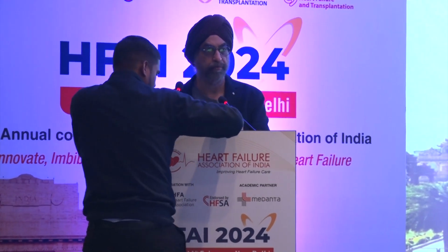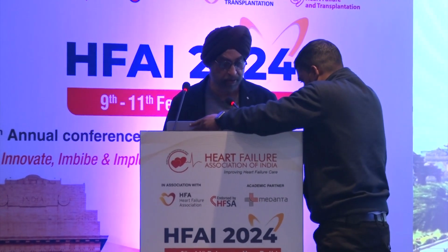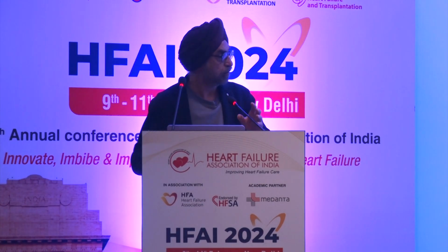So this is going to be an interactive session, and I'm lucky that I have my friend Narasimhan here, and it can make the program very interesting. It's all case-based. These are real-world cases, and there is no theory, all practical. So can we have the slides?